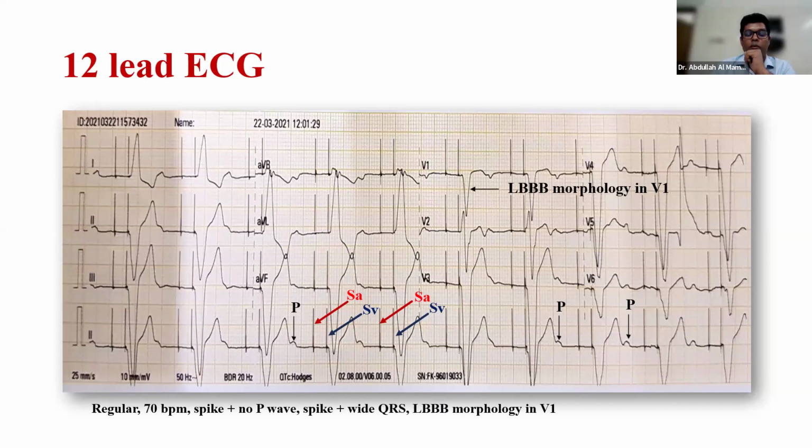As there is no P wave after the atrial spike, there is atrial capture failure. There is also a P wave that the pacemaker does not recognize, so there is also sensing failure. So this is a dual chamber pacing ECG in which the RV lead is working nicely, but the atrial lead is not working, evident by atrial capture failure and sensing failure.